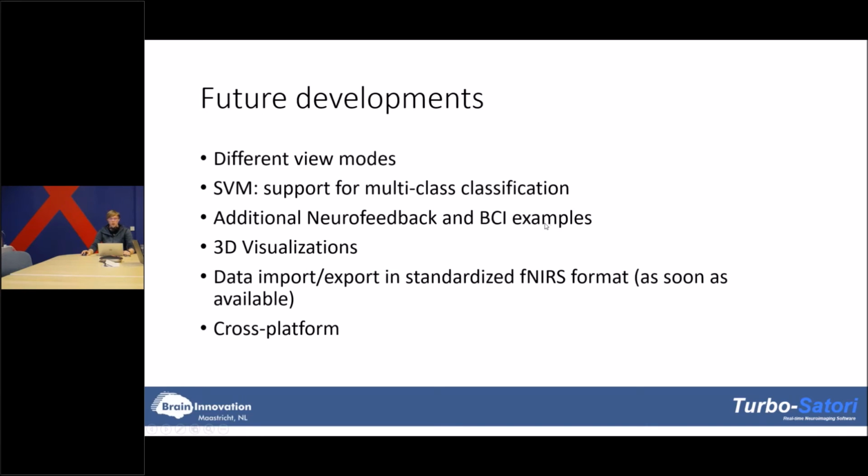And we will have as well 3D visualizations in the software, but this will be in a later stage. The data import and export is currently the header format, but we will also support the .nirs format soon. And if there's a new NIRS standard, then we will also support this one. And the cross-platform compatibility is also on the list of features.